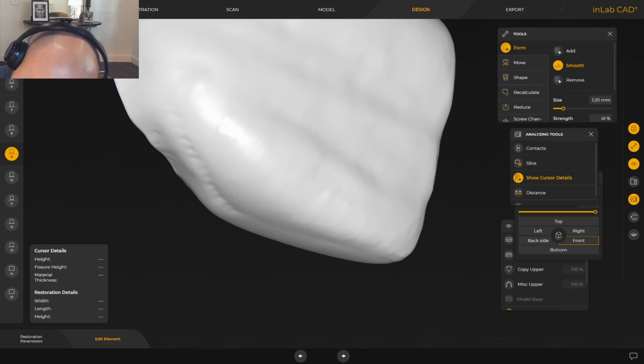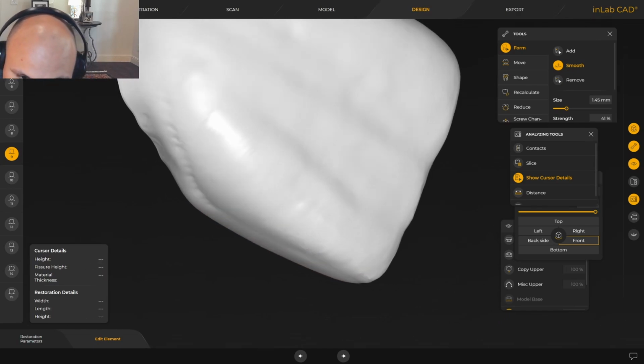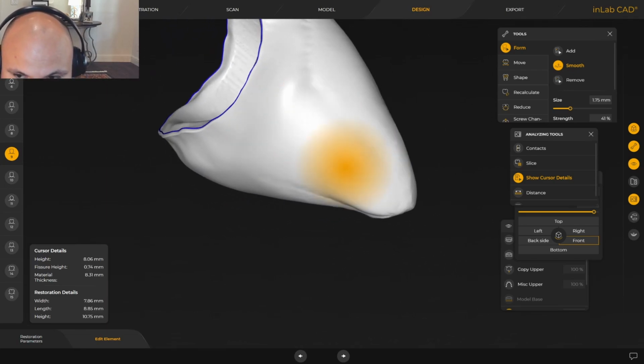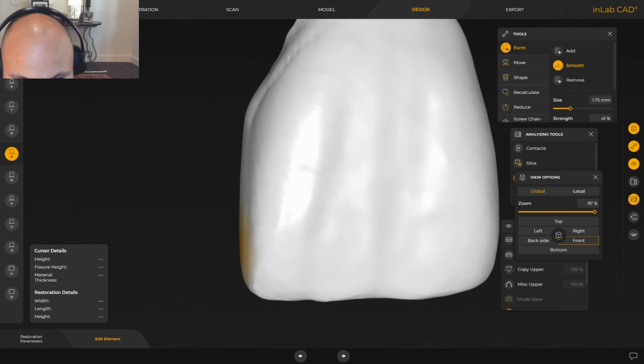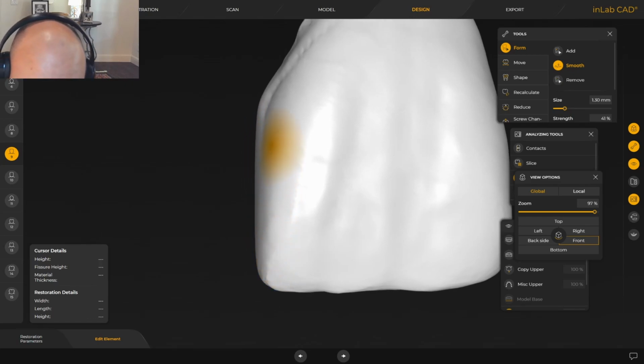Okay. Boom, boom, boom. And we're looking at it from this angle because you can start to see when things are vertical. If we were looking at it from here, head on, you can't see if you're making a vertical line, whereas if you're looking at it from this angle, you can see if we're keeping that midline vertical. So I could pretty much stop the video once we get this midline done, because you'll get the gist. But we'll do a couple of these just so you can really digest what I'm going to show you here. And you can already see where we're going.